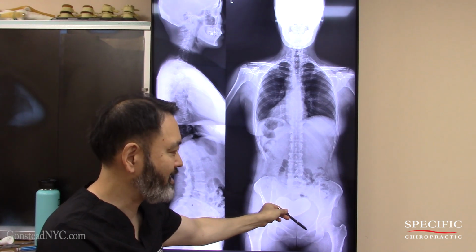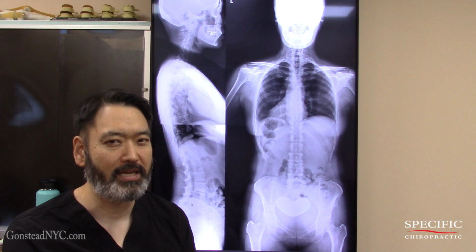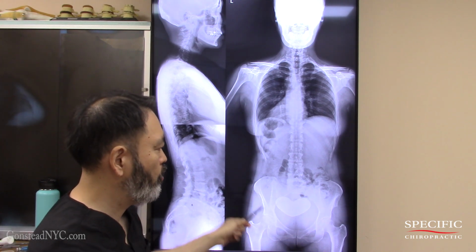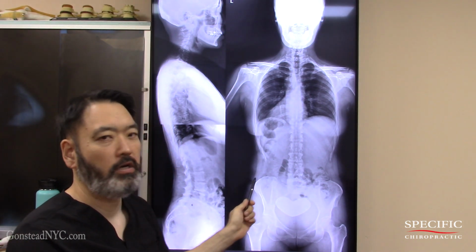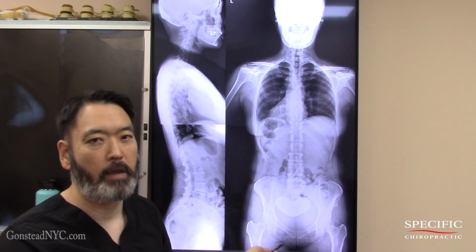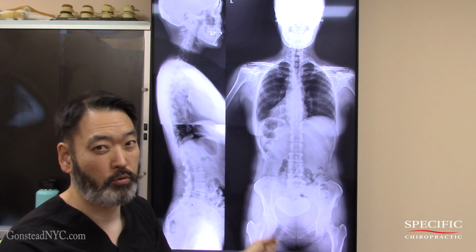So what can make it sink down on that side? Well, there's got to be a PI-EX, or an anatomically short leg on that side, possibly. What can make things raise higher on this side? Well, it's got to be an AS-IN ilium, or a posterior rotated sacrum on that side, or a sacral segment issue.